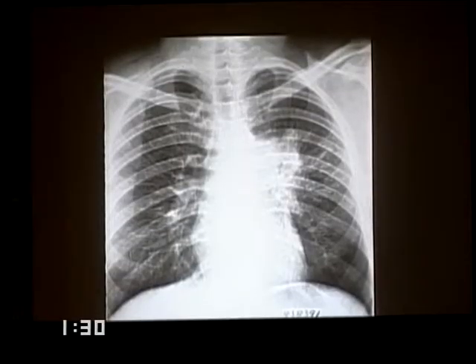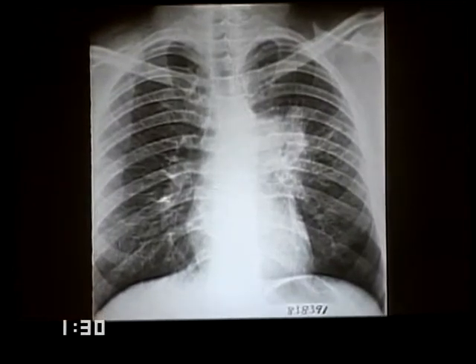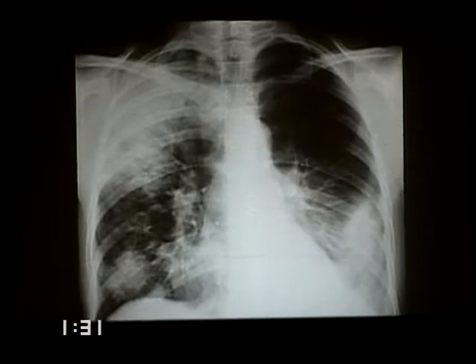And again, just for the nostalgia that I expressed earlier, I'm showing you a case of an airspace disease which remarkably simulates lung cancer. And this, of course, is a fairly characteristic manifestation of blastomycosis, which we actually recovered by doing a transbronchial biopsy. And the report came back positive on the morning the patient had already been taken to surgery. Some other examples of airspace disease.